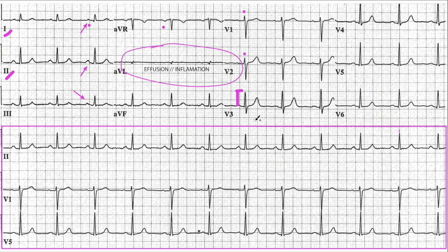I'm not even seeing that equiphasic, right? The equal parts R wave, equal parts S wave in lead V3. It just went into R wave. So this is what's known as early R wave progression. So there's something causing this R wave to become a lot bigger than expected in lead V3. Again, non-specific indicator, but an excellent indicator of something non-specific.